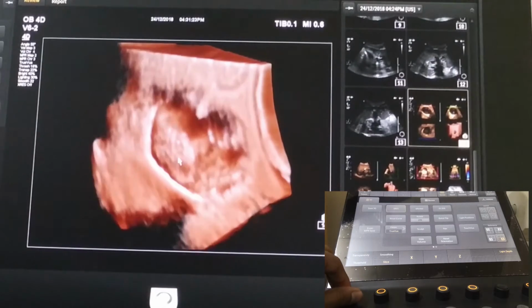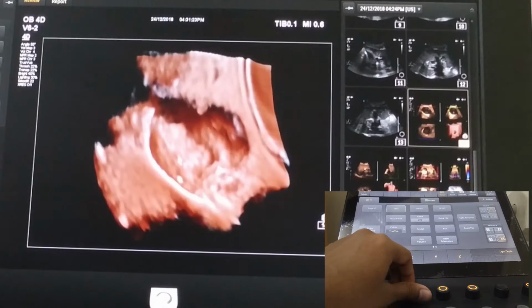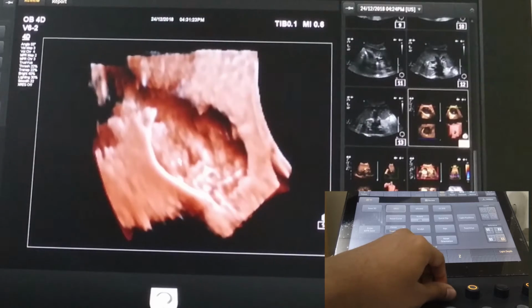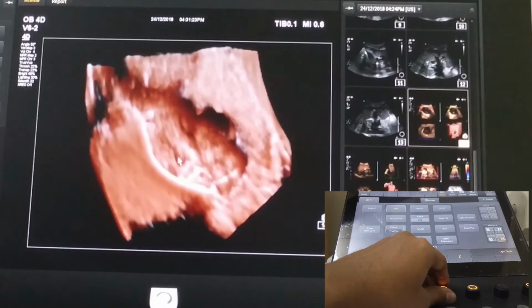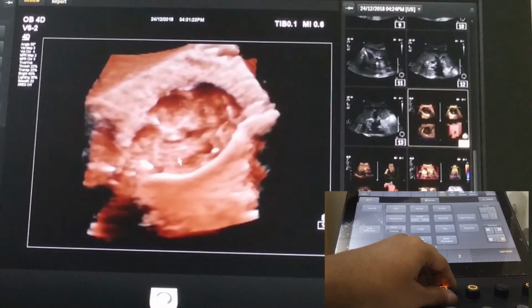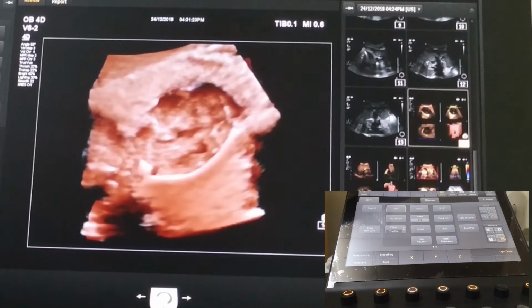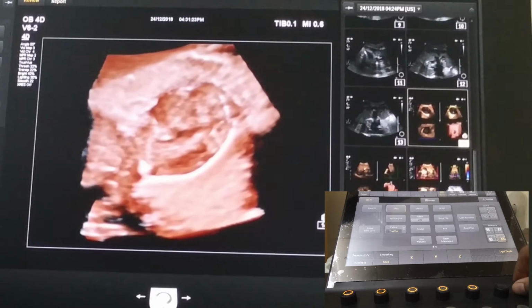Luminal sludge is a little visualized. Always rotate freely in different axes. You may get a better view and it will be helpful to evaluate the anatomy as well as the pathology. Now I will change the light source. Take the torch everywhere. You can change the light depth to have a better lighting condition.